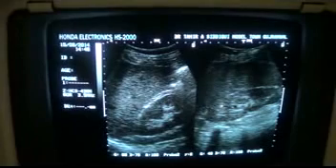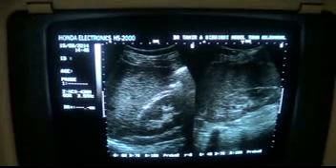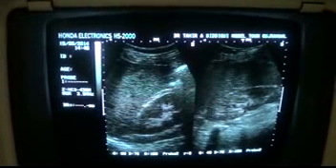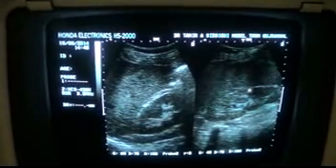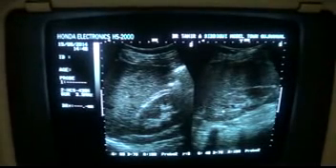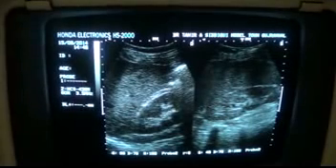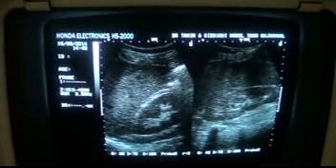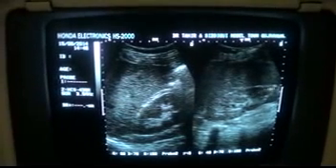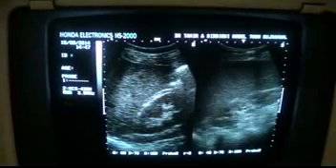So this is the normal kidney. You can compare it with it. It's very easy now to compare these two. So this is a kidney with diffusely increased or raised parenchymal echogenicity with muffled corticomedullary differentiation. Another thing to note, which I am going to inform you, is that this is the central sinus echo-complex fat. You can see, so we don't see this in this kidney. So this is almost renal parenchymal disease, grade 1.